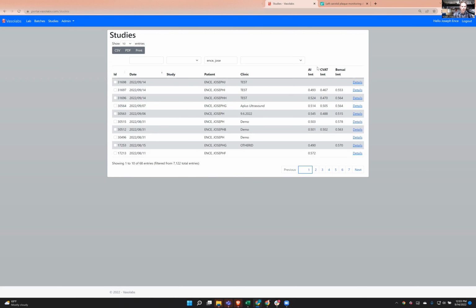I don't have to. The AI measures the intima lining right when it uploads on all the images that are notated to be measured. It's pretty good measurements. I'm going to measure it on a scale of 1 to 100, so I'll just move the decimal place a little bit. Over time, I went from 50 to 50.3 to 54.5, 51, 52, 49. Pretty consistent on the IMT. My personal score, CVAT, the measurement 46, 47, 50, 48, 50. Not bad. And then measuring it on the ultrasound box itself, the bonsai, we call it, 53, 56.